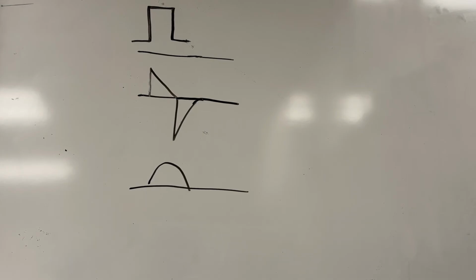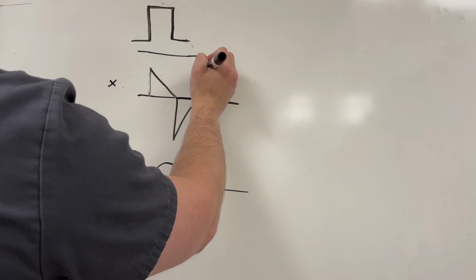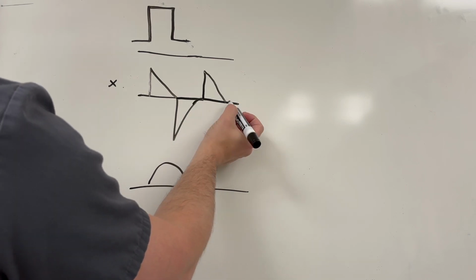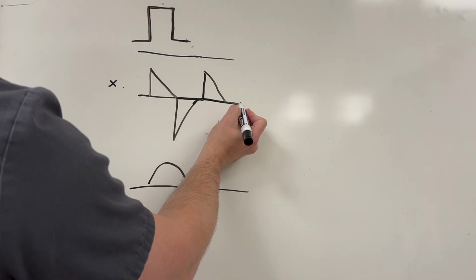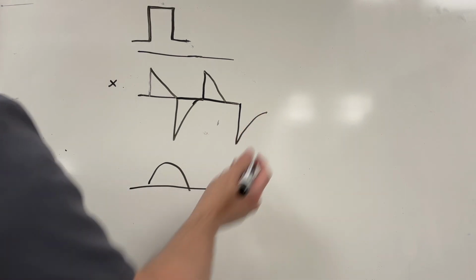For mandatory breaths, if we set an eye time that is too long, you're going to notice that on the flow waveform as well. What that'll look like is when we go into inhalation, we go straight up, hit our peak inspiratory flow, and decelerate down and hit zero flow. But we don't go straight into exhalation. Instead, we sit here at zero flow and then later on go into exhalation over here.